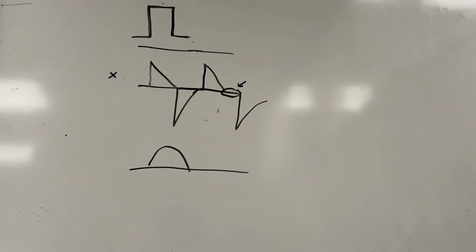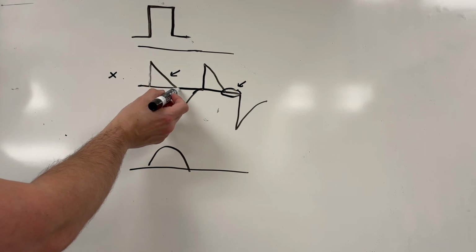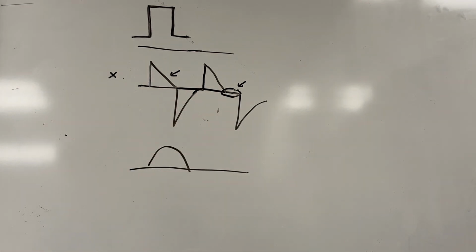So in this case, we're most likely going to want to decrease our eye time so that it looks more like this one, where we hit zero flow and go into exhalation. Because even though a breath hold every now and then may be a good recruitment maneuver, it's not something you're typically going to want every single breath that the patient has in their mandatory mode. If you can't get it to go away, you can talk to the doctor, let them know what's going on, and see what they want to do.